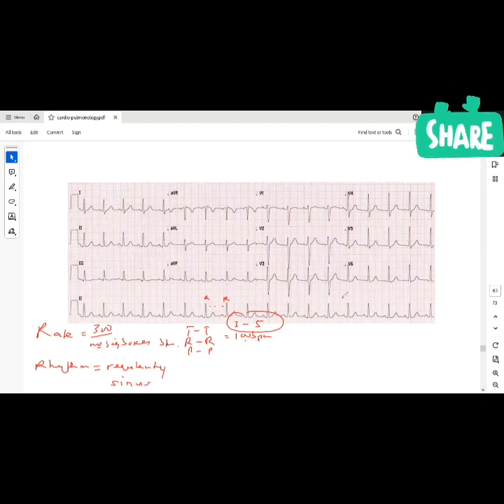This case is very straightforward. This is regular. Just by looking at it broadly, the spaces between the R waves are the same, about 3 big boxes each. So this is regular.